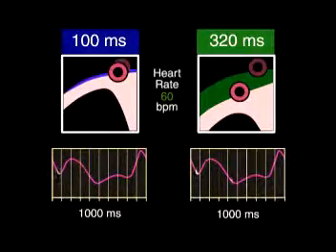When viewing both the EBT and CT diagrams side by side, based upon a heart rate of 60 beats per minute, one notices that the CT device only acquires data every other heartbeat. This is because today's most advanced CT scanners use most of the R to R interval acquiring data and therefore do not have time to increment the table before the ideal trigger point in the next heartbeat. Imaging every other heartbeat often requires 2 breath holds to complete each CT examination.